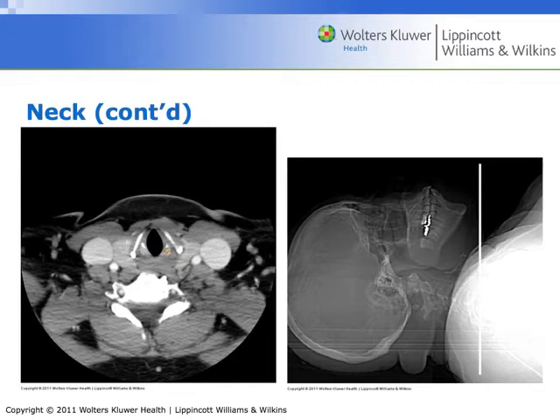Within that, there are some smaller white lines right here. That's the cricoid cartilage. We saw this on the last slide, the sternocleidomastoid muscles. These big structures here, any of the vascular structures, are the jugular veins.